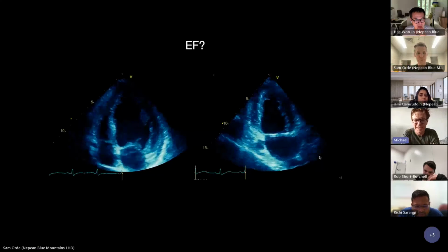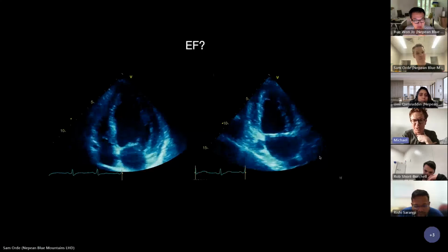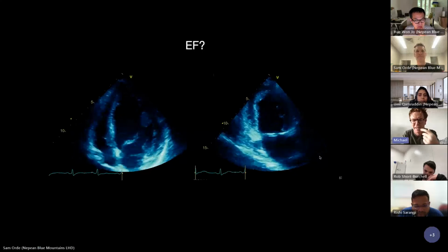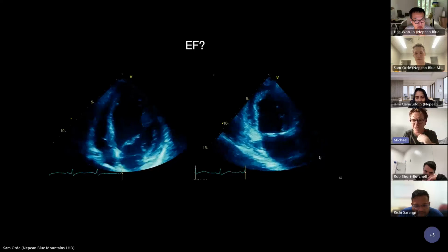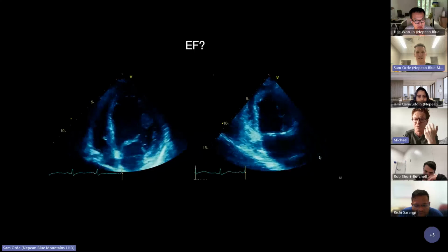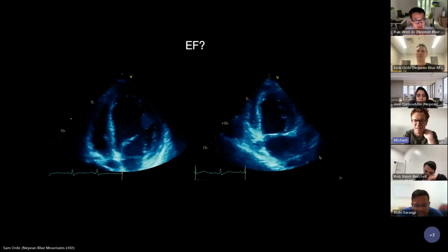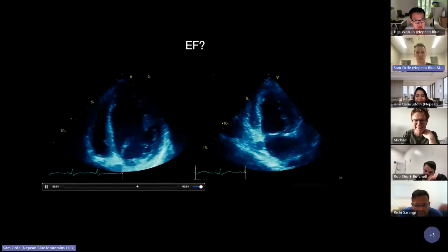So it looks like the ventricle is impaired, but the images are off axis and it's a bit foreshortened. I can't really see the apex very well, but on the 2-chamber you can see the apex shortening quite a lot. So I think it would be tricky to talk about an EF. I can't especially measure an EF in this person. Beautiful. I'm sorry I tried to trick you, and well done for figuring all that out.